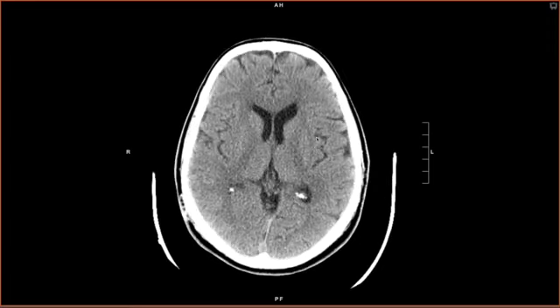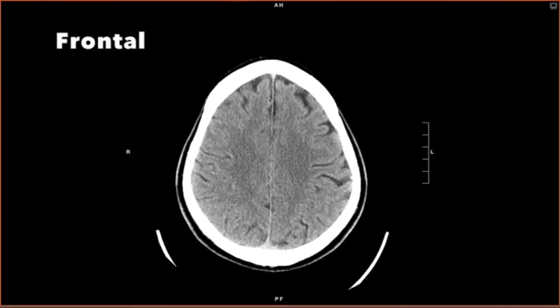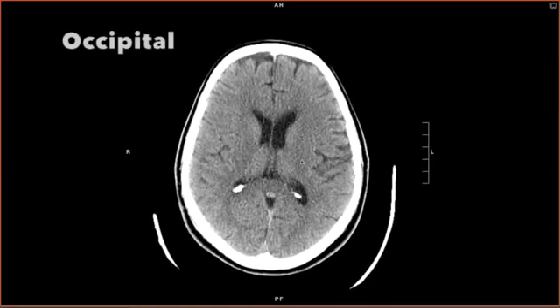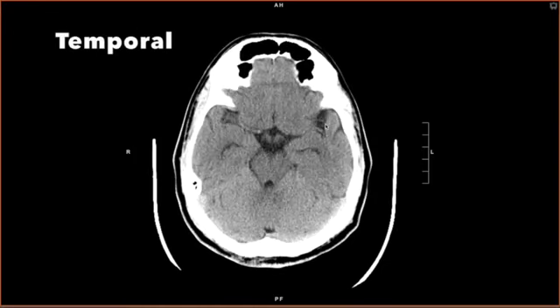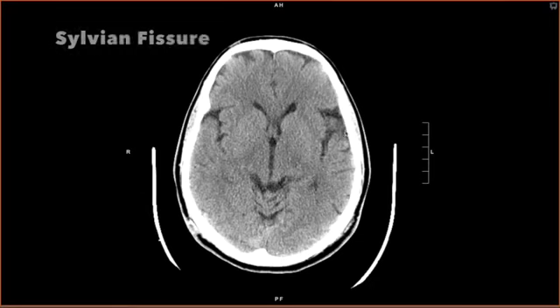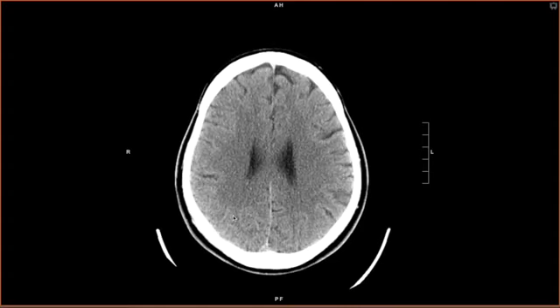The supratentorial brain is separated into lobes, which many of you guys know. The frontal lobes here, the parietal lobes back here, the occipital lobes back here, and the temporal lobes over here. The specific divisions between the lobes is beyond the scope here, but I do want to touch on a couple. First, these here are the Sylvian fissures. Sylvian fissures separate the temporal lobe below from the frontal and parietal lobes above.